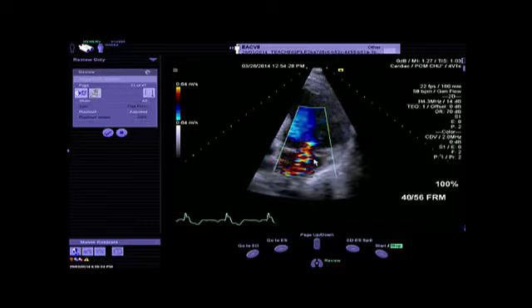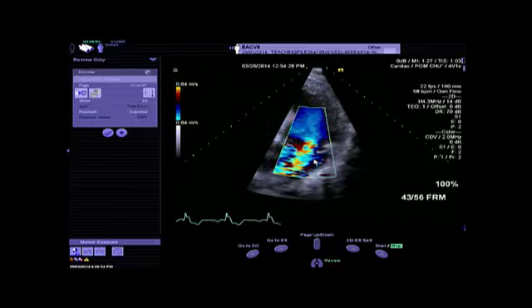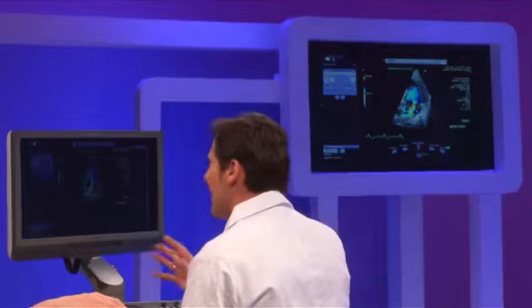It is a turbulent jet, and we know all the limitations of the regurgitant jet area related to technical and physical factors, and this is the reason why color flow Doppler is just used in this situation to see the mitral regurgitation, but not to quantitate it. We should use more quantitative parameters, and the apical 4-chamber view is the recommended approach to use the PISA method.